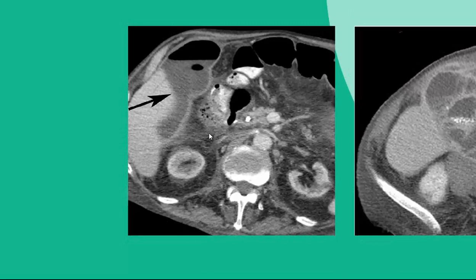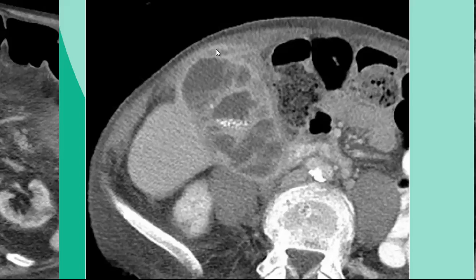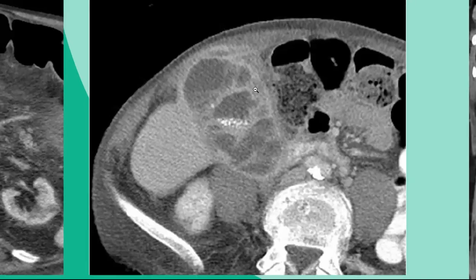Here we have a CT scan of what looks like the gallbladder, but note there is a chronic inflammatory process going on here with thickened septations, intramural nodules, and a heterogeneous wall enhancement. This is xanthogranulomatous cholecystitis, sometimes indistinguishable from tumour.